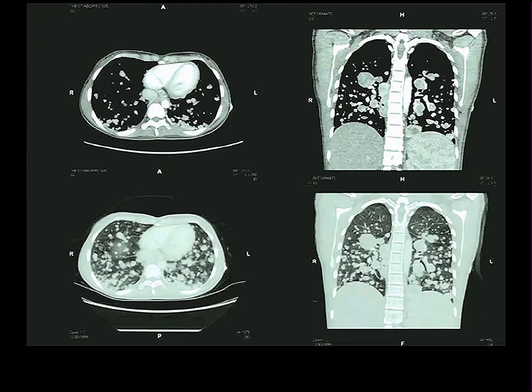There's other things that can alter the way CTs look. This is a person who has metastatic carcinoma to her lungs. And the heart looks fine. These lungs have all sorts of things in there that shouldn't be there. It looks like she's got a tremendous number of metastases to the lungs. That's with a CT done for what's called soft tissue density to show the heart best.